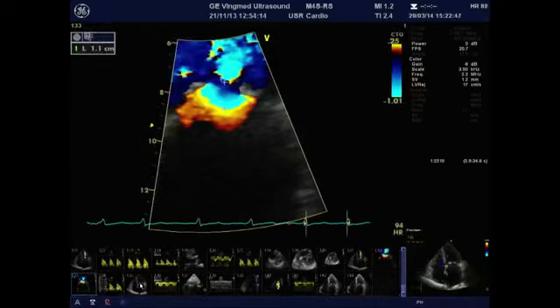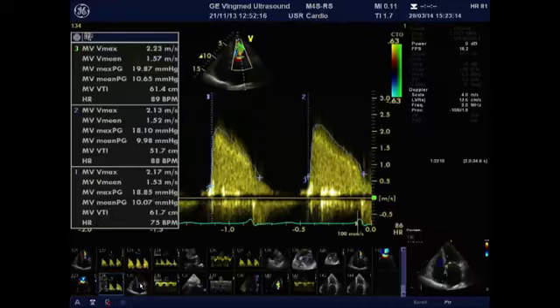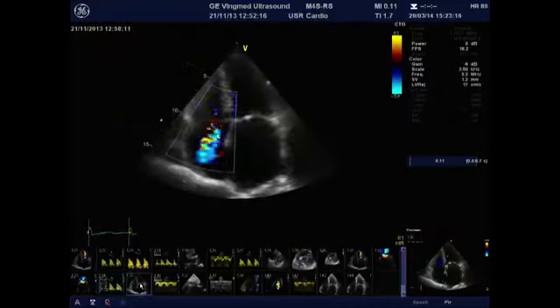In the case of mitral stenosis, we will usually have to make an angle correction because the plane of the orifice is not flat, and we will usually use a correction of about 100 degrees, thus multiplying the result by 100 divided by 180. So, and we can see in this case again that the pressure gradient is 11.